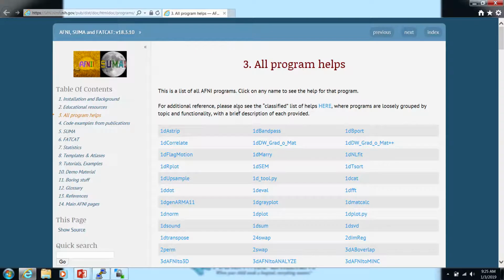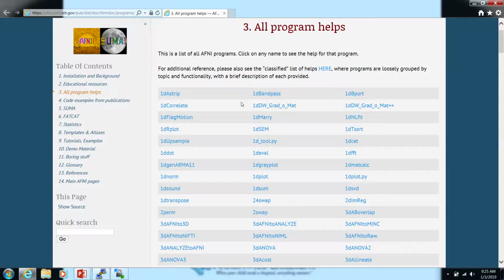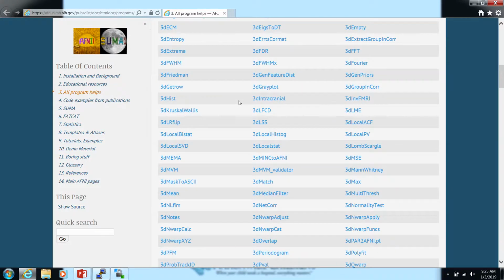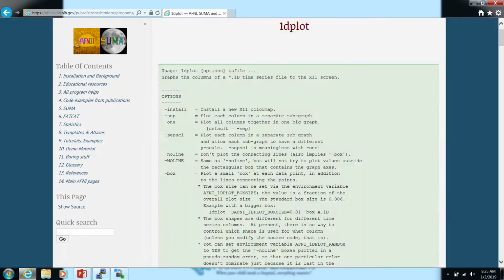This is a list of all of the programs that are part of AFNI. This includes complex programs as well as little modules that are used in other programs for very specific goals. Within each of these, if you click in, there are usage directions about how you use it.